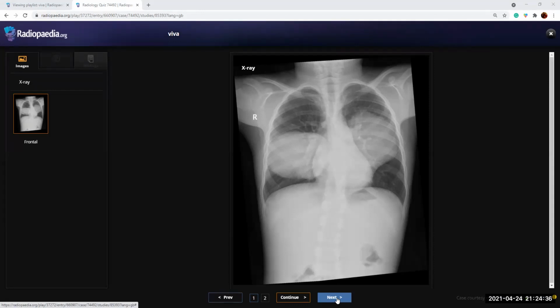Okay. This person didn't have anything, so you want to do anything further for this, okay? I will look at the comparison with the previous images and I'll take it further with the CT scan. Okay. This is the next case.